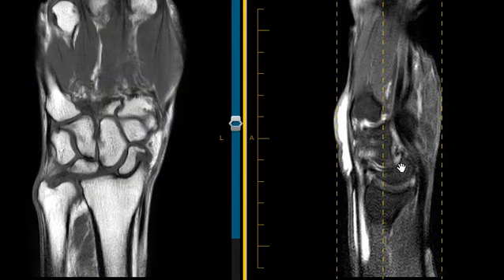The abnormal tilt here, the ligamentous instability, is associated with a tear of a ligament which is right here. This is the scapholunate interspace. So the scaphoid bone and the lunate bone have a ligament called the scapholunate ligament, and that is torn. That ligament will hold these two bones close together, but you can see how there's a big gap between them because the ligament is ruptured.